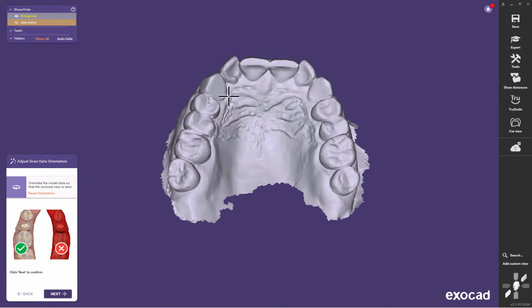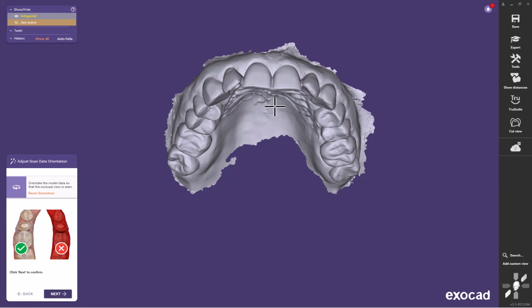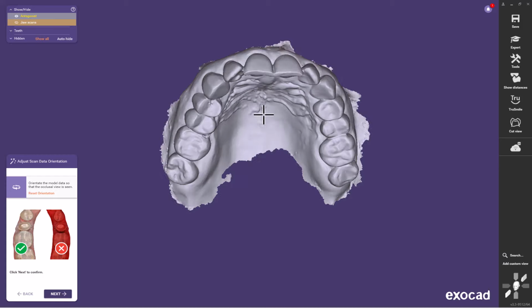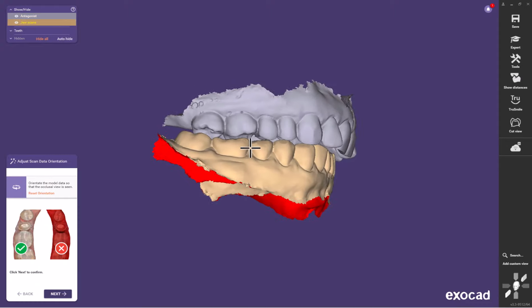We see this all the time, that the cingulum gets ignored, or for whatever reason they're doing everything in CO and they just make these flat contours. I figured out that if I just add a cingulum, I am actually able to get these cuspids to come into contact. So what I did initially is I began equilibrating these models.